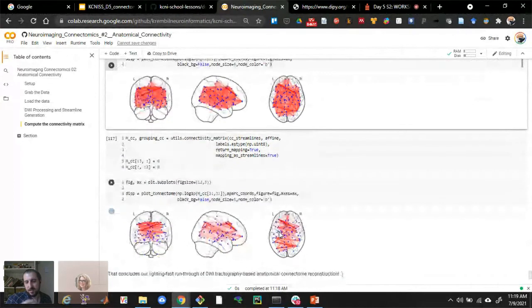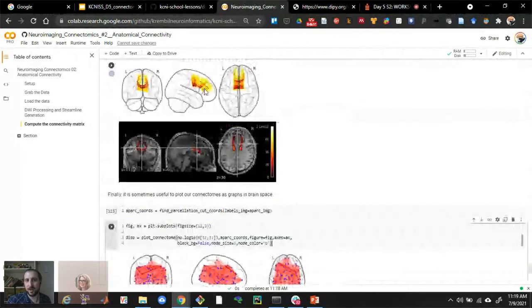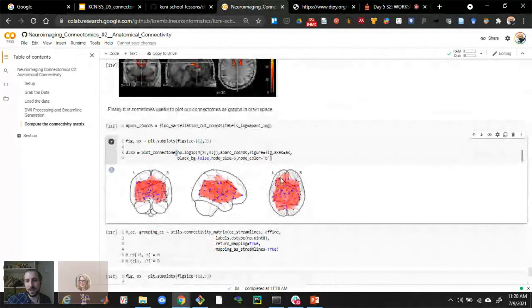Sometimes you can color things with modules, and there are things you can do to help, but I'm really just offering a cautionary note on three-dimensional space visualizations. I'll distinguish this from the tractography, right? The tractography streamlines are the actual fiber pathways that we're reconstructing. These things are lines we're drawing in 3D space. This line doesn't exist. This isn't a real thing. This line is representing the actual fiber tract that is maybe going via the corpus callosum there, and it's convenient to draw a straight line when you want to do a three-dimensional representation of a network or a graph.